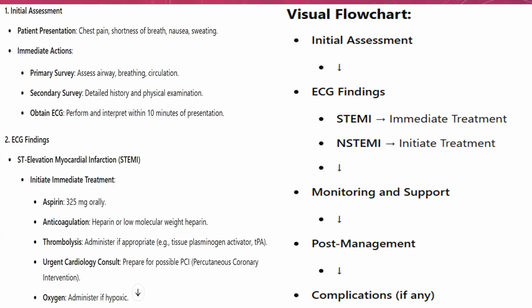Now, in all honesty, if this was my patient sitting in front of me, I would be considering her for pacing as well. But that's another story altogether. We're just looking at the ECG for now, not the complete treatment as well. So this is the type of patient that you would follow these.